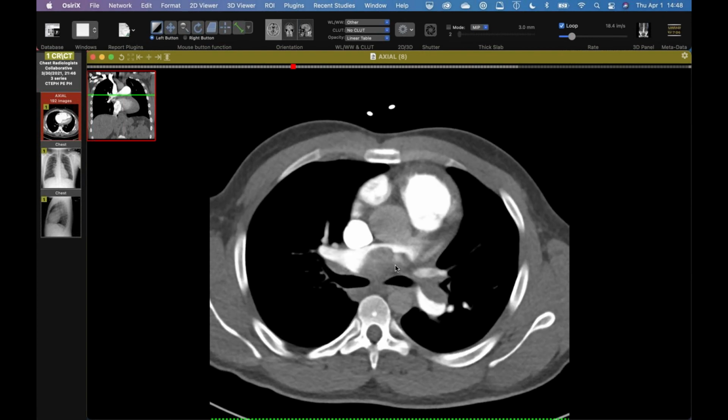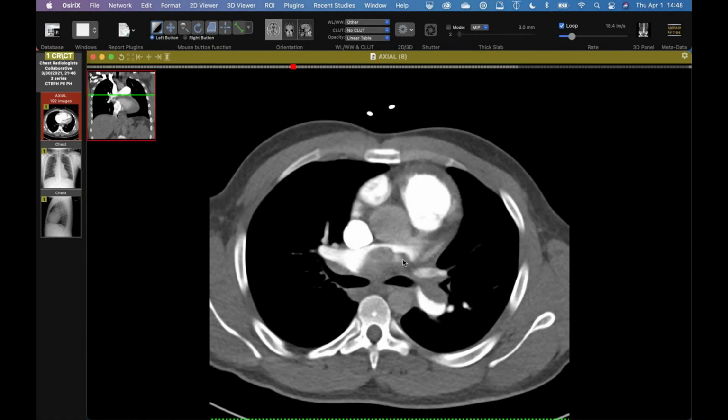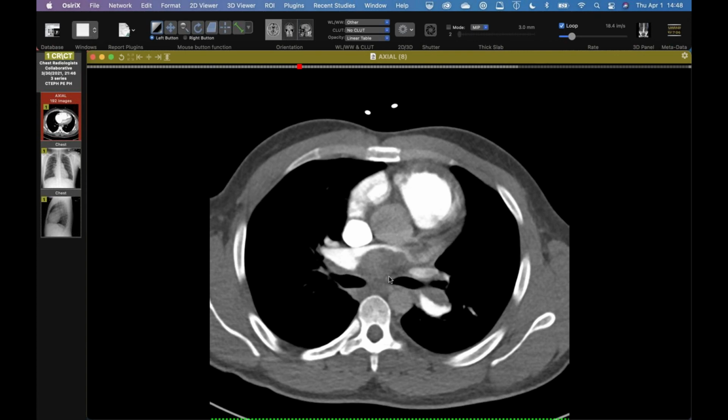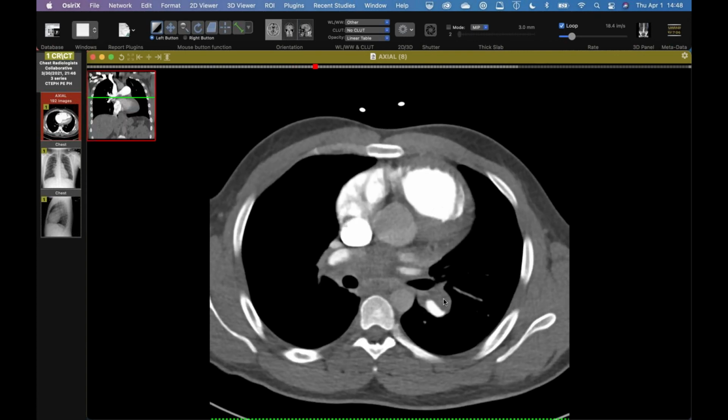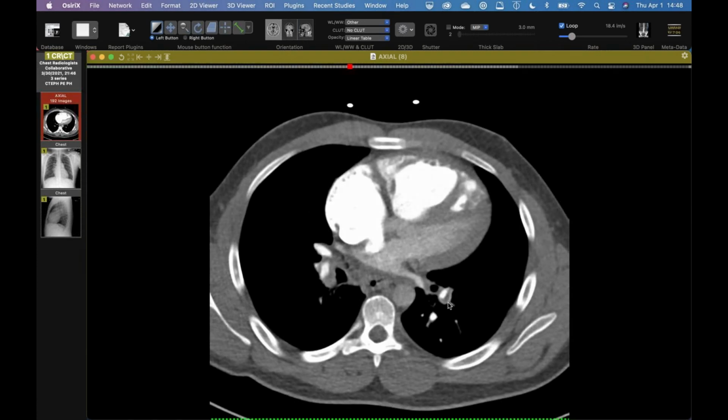I agree. I think there's definitely CTEPH here, but I don't know if in some patients the pressures get so high that you just start developing in situ thrombus superimposed on it. Supposedly it's very common. I kind of wonder if this is an in situ thrombus here. Yeah, and this is the CTEPH here. And we have cases that are clearly mixed all the time. I just had a case of scleroderma this morning that was clearly mixed, had layering in situ thrombus, and then distally everywhere else she had CTEPH with webs and stuff.